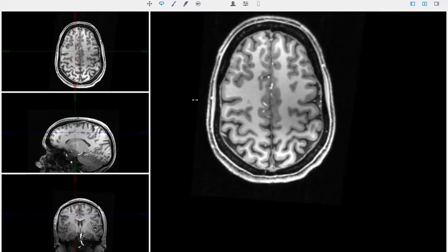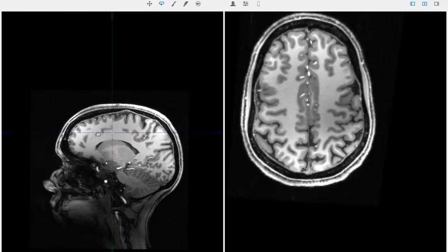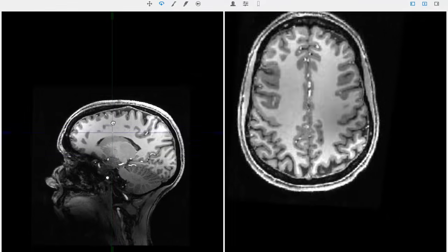Here we are in an axial section. This is frontal lobe. At this point, because we're so far forward, if you see the slice where we are right here, we've cut through this blue line right here. We're not in occipital lobe. Back here, even though it's the bottom, is parietal lobe. And so that's something kind of tricky that I've got to pay attention to. You don't see occipital lobe until you get much further down.